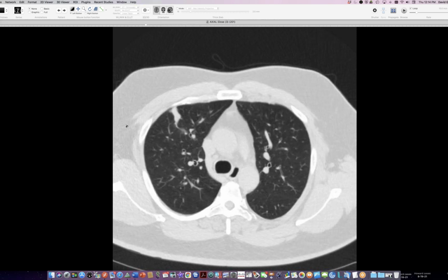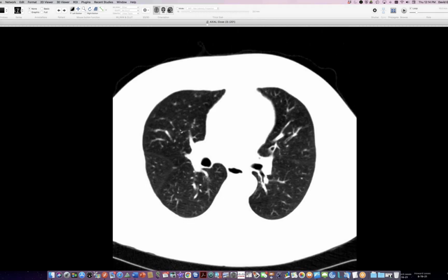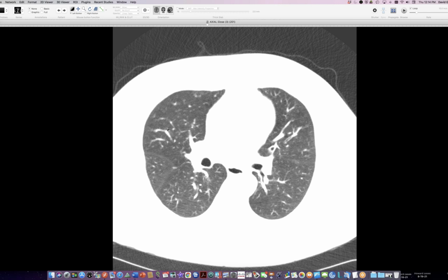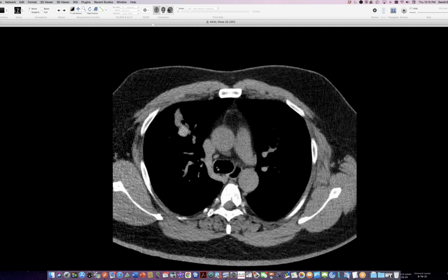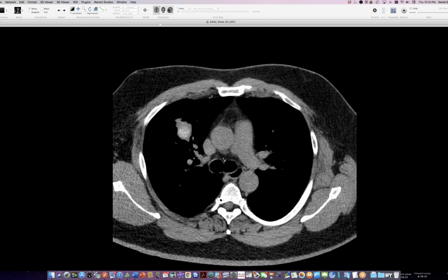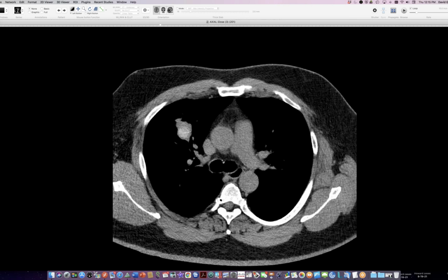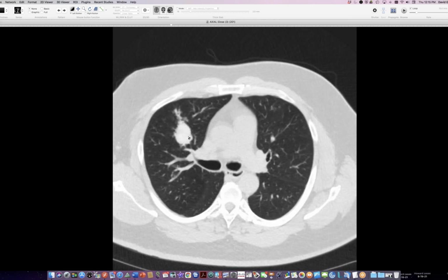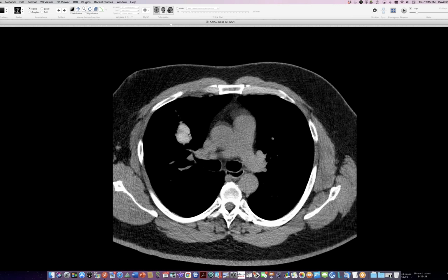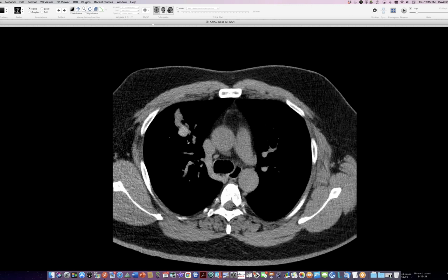It's an elongated branching lesion above the right lung hilum, and there's some rarefaction of lung peripheral to it. You can see the lung tissue is a little bit rarefied out here in kind of a wedge shape beyond this thing. And then it has this high attenuation component centrally. So it's not as spectacular as Jeff's case from a couple of weeks ago of a mucus plug in ABPA. And evidently it's aspergillus in the mucus plug that is busy gathering up minerals.